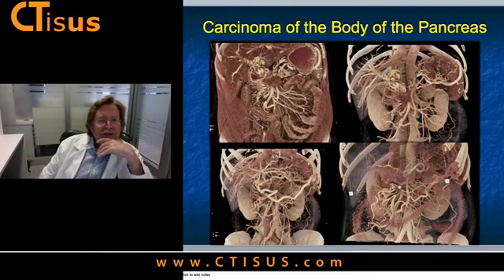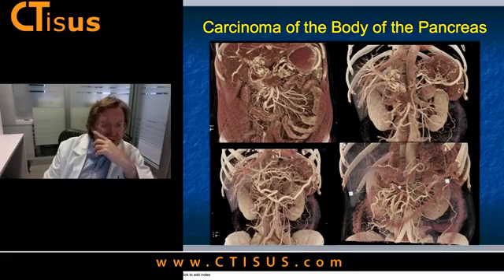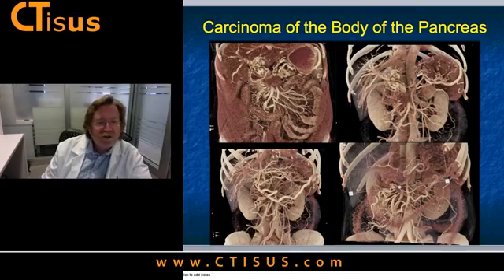So one of our classic applications is in the pancreas, and this article by Linda Chu this month in AJR is very good, showing, in this case, for example, the mass in the body of the pancreas, the encasement of the arterial and venous structures, and multiple collaterals. Very good look at the perspective of depth, the extension. The surgeons, Chris Wolfgang, Matt Weiss, and the like, just love this in terms of preoperative planning.